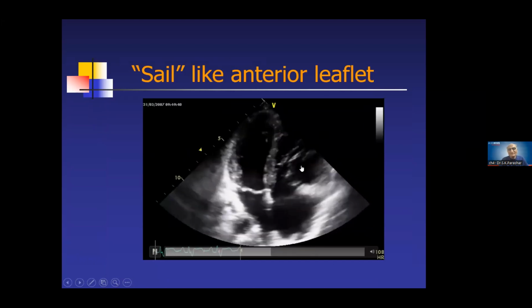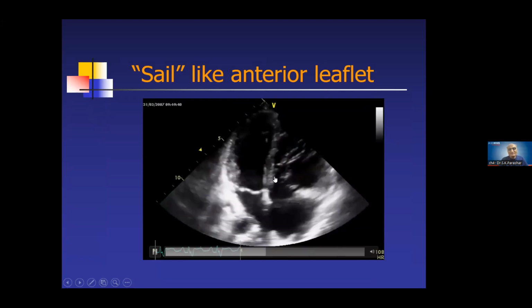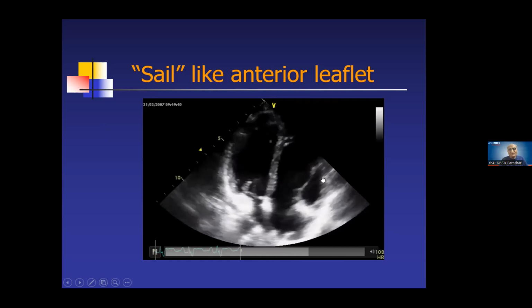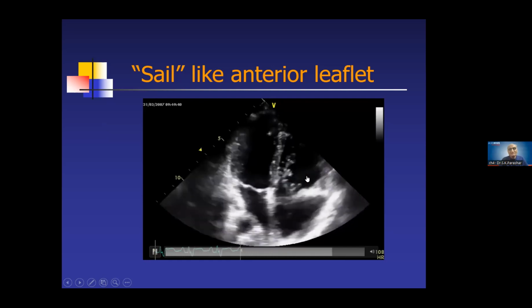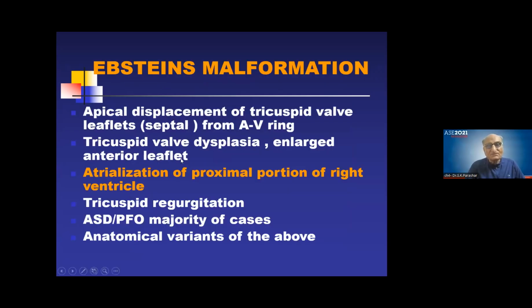like a sail of a ship in the sea. In this we see a marked shift of the septal leaflet, and you see this large sail-like anterior leaflet. So now you have seen both.